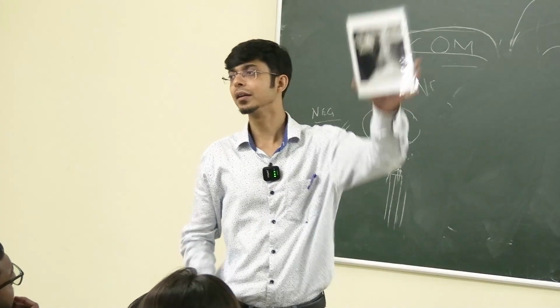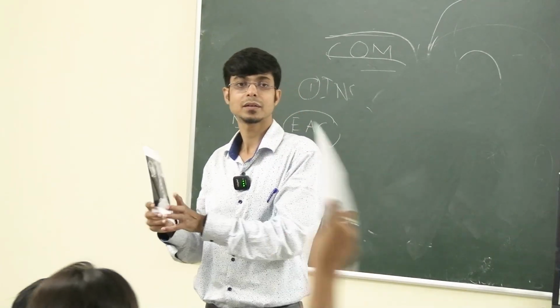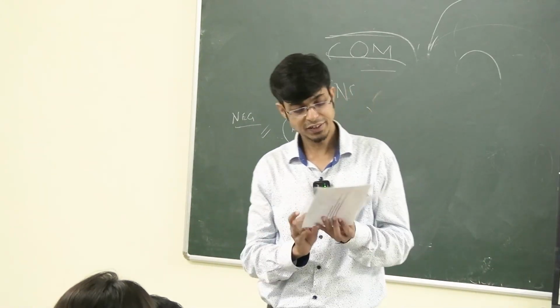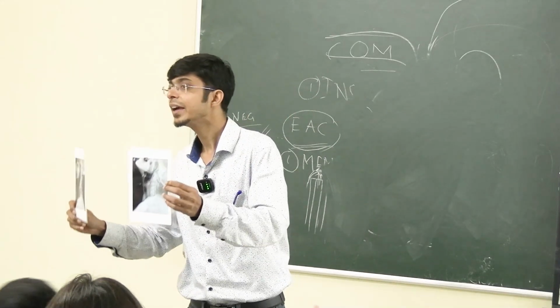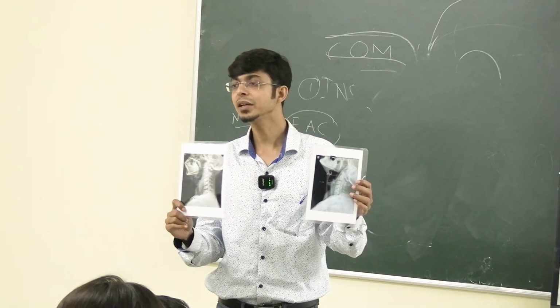So first this one, where are the other ones? See, these two, the two X-rays I showed, what is this? Who will tell me?